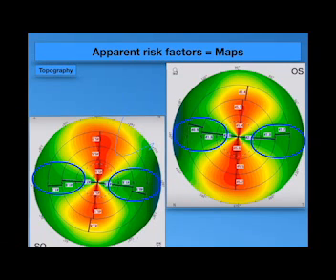So if there is any deviation of one of the lobes of the bow tie, especially the superior or the inferior one, and there is an angle between them which is more than 15 degrees, you may suspect. If this angle between the superior and inferior lobes of the bow tie is more than 21 or 22 degrees, you have to highly suspect that this patient has corneal abnormal points. Please don't worry about the superior steepening. The most worrying is the inferior steepening.